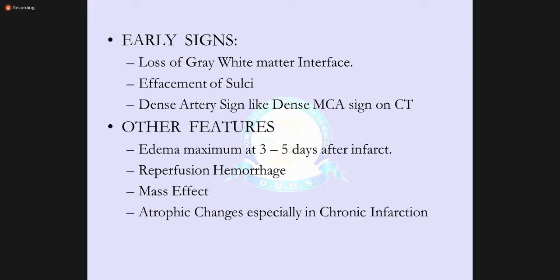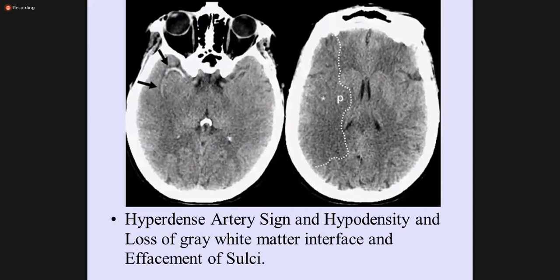This is the CT scan brain, plain axial section. Why am I saying plain? Because no contrast has been given. So whatever is bright is either calcification or blood. Here comes the role of our knowledge of anatomy. Radiology is nothing but anatomy. God has given us two equal sides to compare.